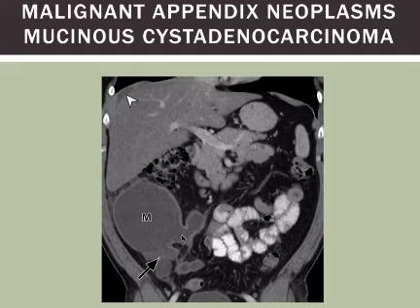This is a malignant mucinous secreting cystadenocarcinoma. Very worrisome tumours, as they tend to perforate and epithelial cells then track, and produce mucin where they locate.